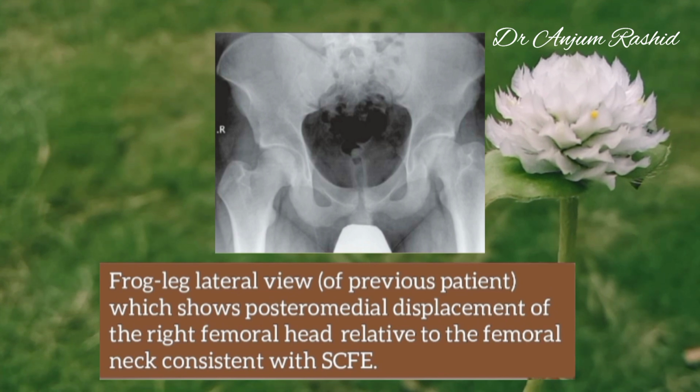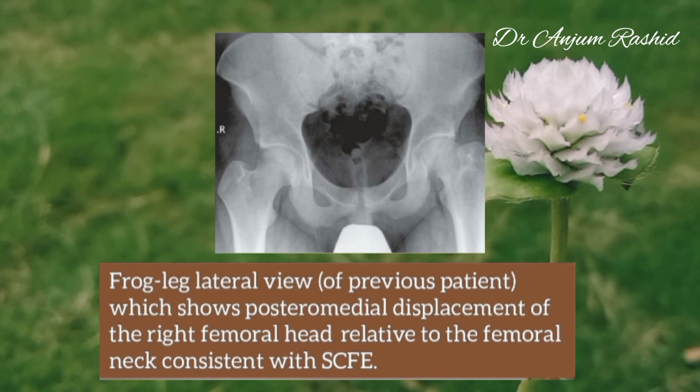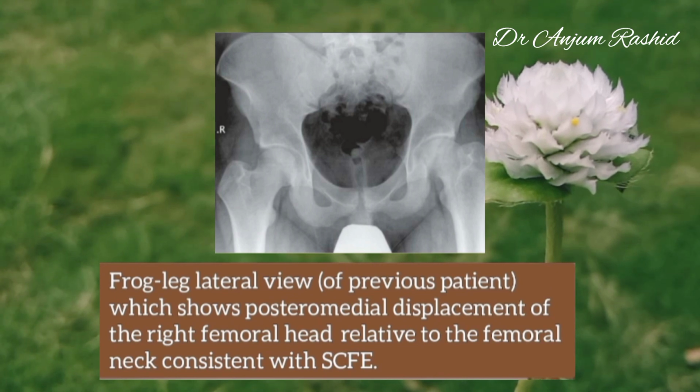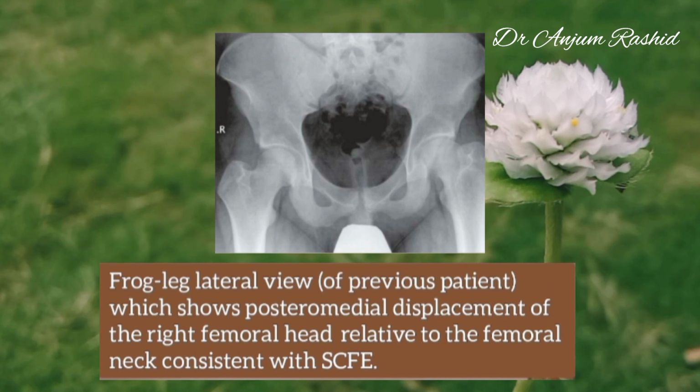Now, frog-leg lateral view of the previous patient shows posteromedial displacement of the right femoral head relative to the femoral neck. This is also consistent with slipped capital femoral epiphysis.